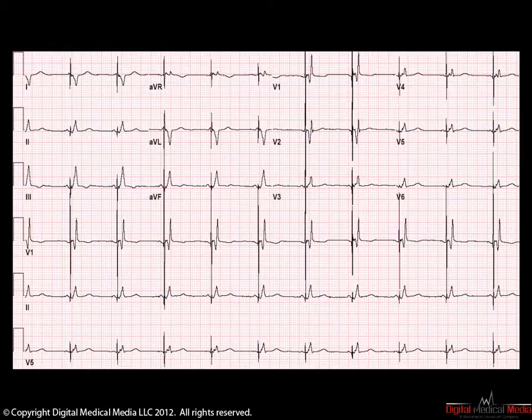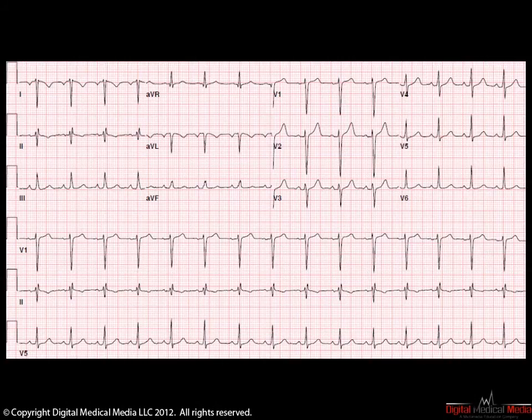Therefore, if pacing is occurring, and it is occurring in the left ventricle, and it is narrow, it is almost certainly cardiac resynchronization therapy. The following 12-lead ECG represents a very specific pattern that is important to recognize. If we look, the heart rate is quite normal and well within the normal values. The P waves are upright in leads 2, 3, and AVF. However, they're also upright in lead AVR.